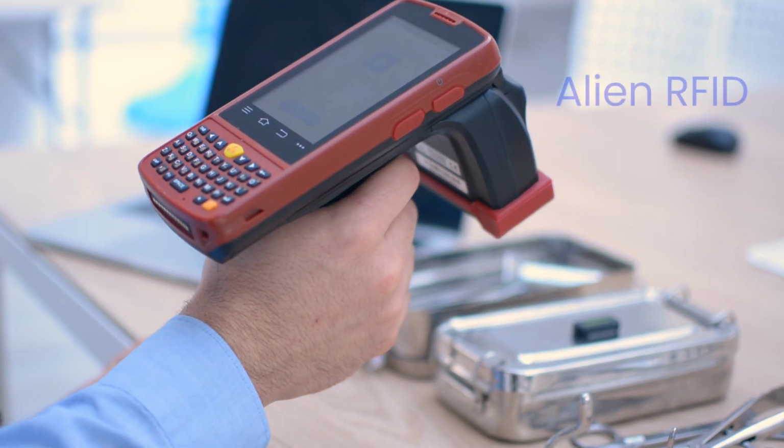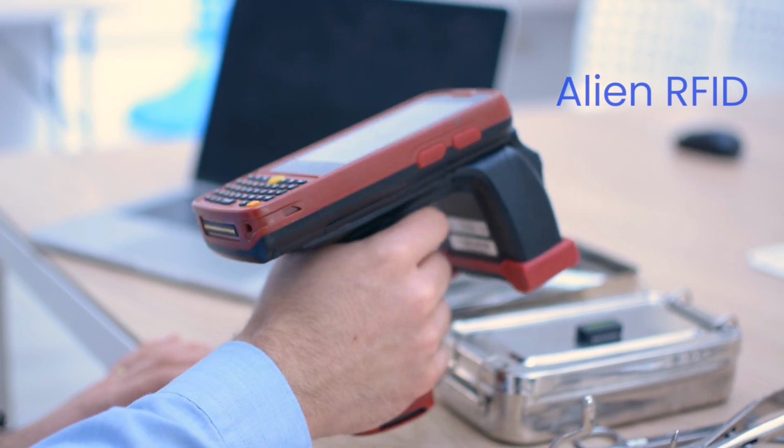The second one is an Android application that runs on smart Alien readers and allows sterilization operators to authenticate into the system and start running the operations. For example, receiving and handing over instruments to medical departments, identifying them, selecting the proper washer or sterilization processes, and validating the load. Let's start by presenting some of SterilTrack's key features.